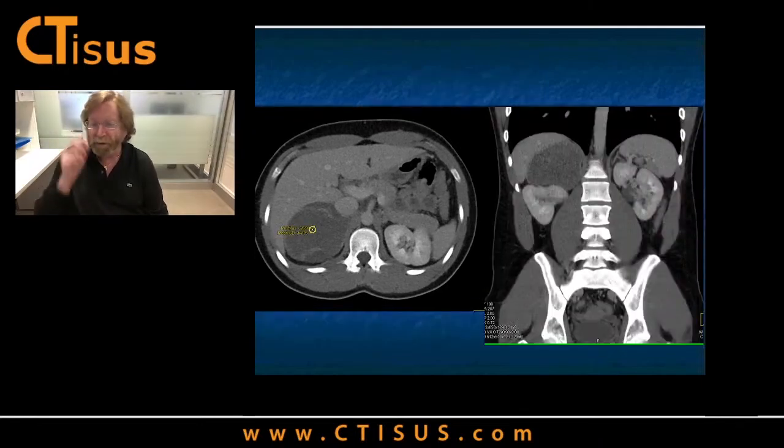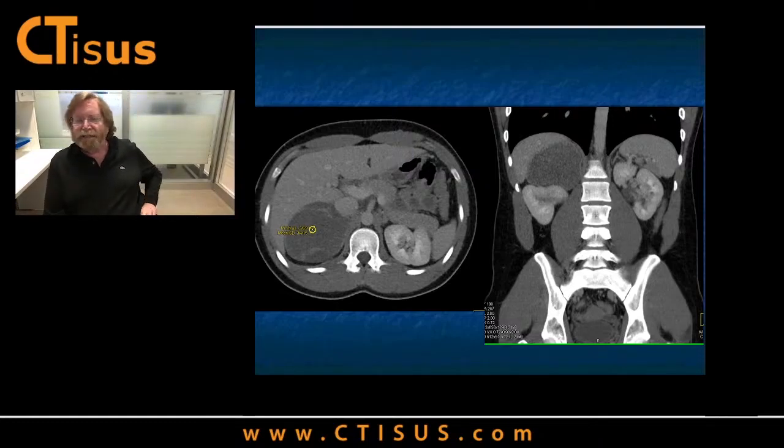Here's another look at it. With the coronal view, you can see cystic, fairly large, compressing the right kidney. What do you think? Well, whenever I see some high density, I always got to think about blood. Surely I can't be saying this is a solid tumor, right? So we got to think about what things give you cystic lesions. Obviously simple cysts, but with simple cysts you would not have septations or some of the higher density. You can have something that bled, cystic pheochromocytoma, primary adrenal cortical carcinomas can bleed.